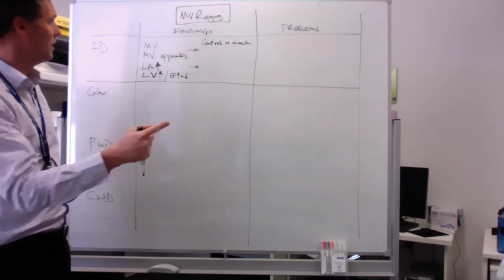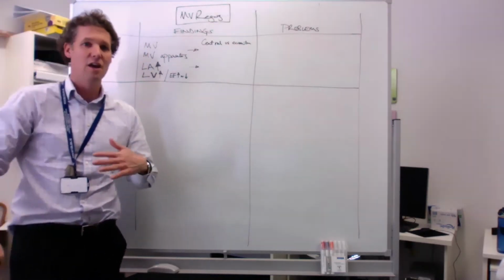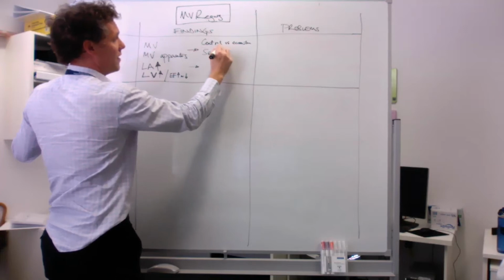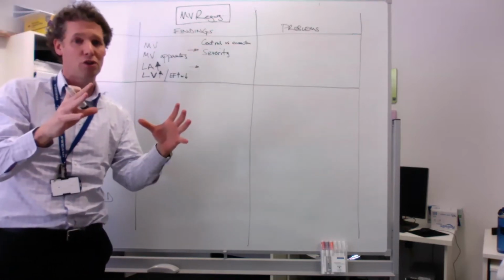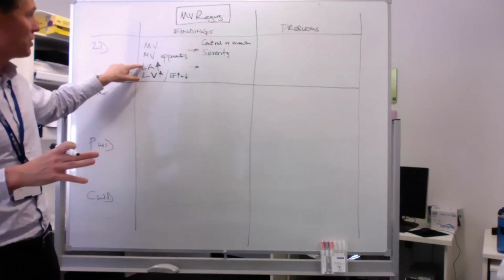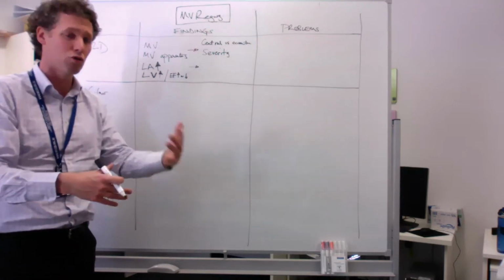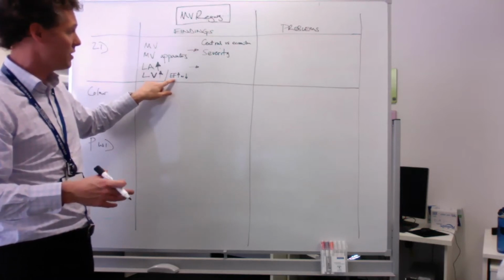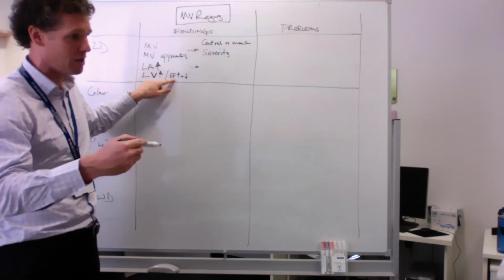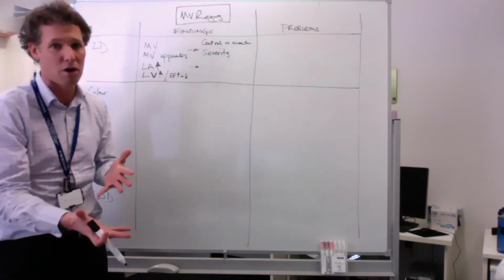First of all, if you see a mitral valve prolapse and a big great hole sitting there for the regurgitation, that's got to help you figure out that it's severe, right? If you can see a big hole on 2D, you're probably dealing with a more significant mitral valve regurgitation. If you're seeing a big left atrium or left ventricle, that's probably going to tell you that it's a bit more chronic. If you're seeing an increased ejection fraction, that again might start telling you there's a compensatory something going on, which would point you away from thinking we were dealing with mild regurgitation.